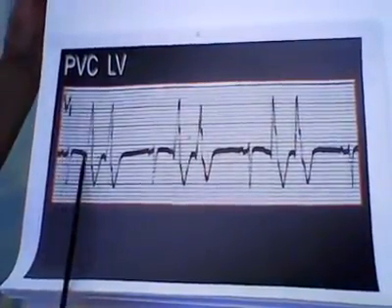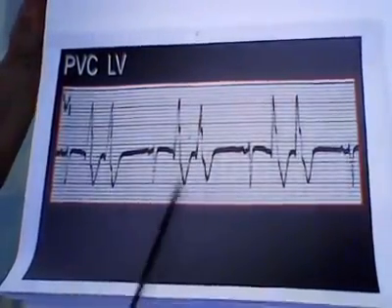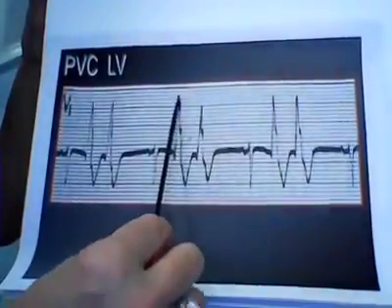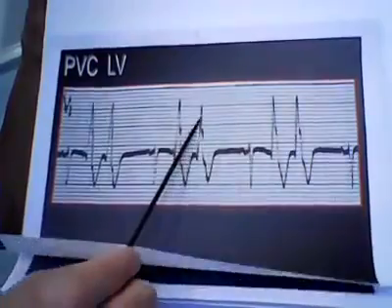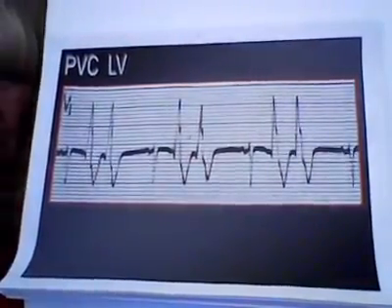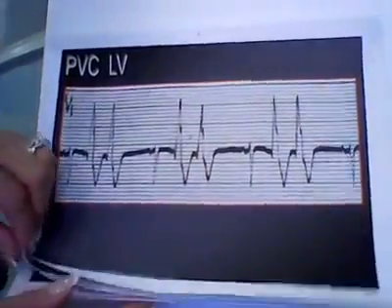P, QRST, and then we start doing this shenanigans here. This is all PVCs from the left ventricle. How do we know? We have big mountain. You have big mountain, you have big problem. This is ventricular bigeminy. These couplets, that's what we're having. I'm sorry, we're having couplets.